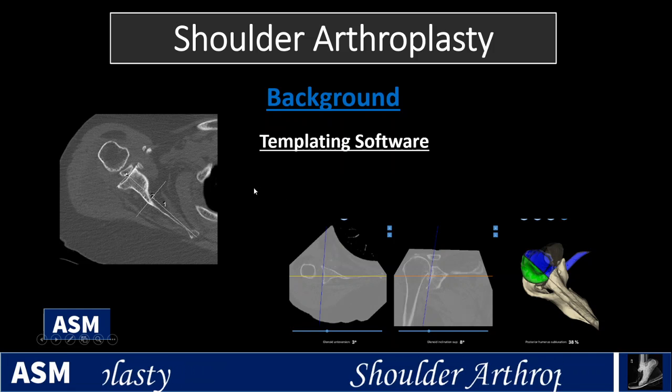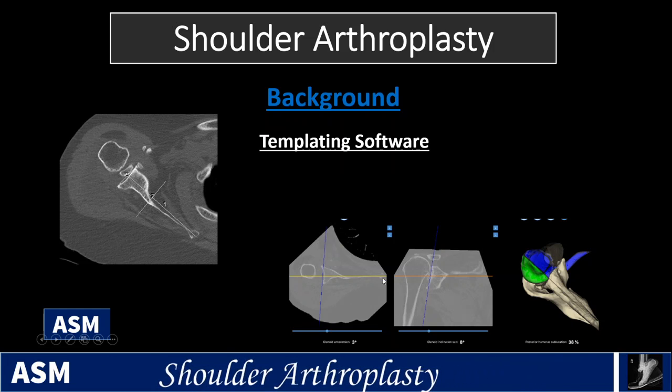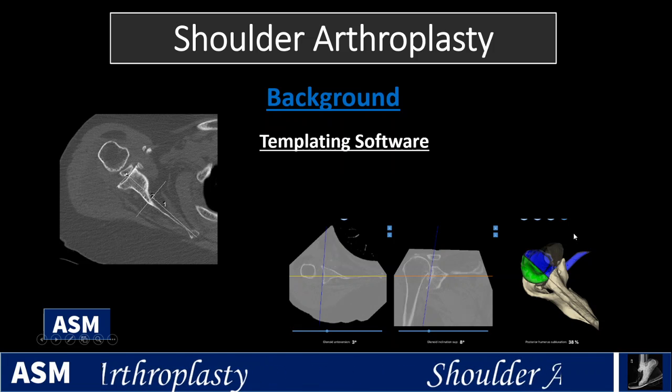So this is just some of the templating software. The source CT here is put into this software, and the software spits out measurements based on the 3D modeling.